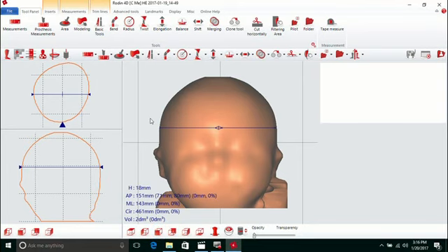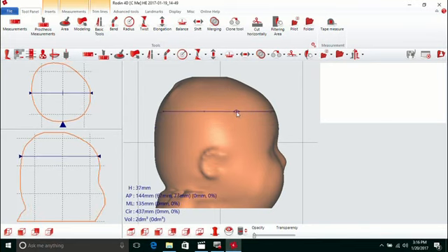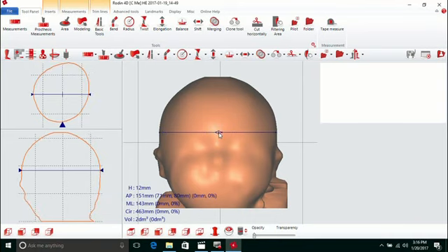If you need to check your location, you can always put the cranial in a side view, and you can left click and also change the height here as well. Just remember, if you do it this way, you want to go in the front view and put your diamond to the front. So what I'll do is click on my cube anterior and then left click where I want to drop that diamond. Okay, now our height is set.